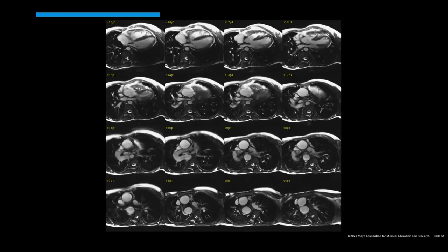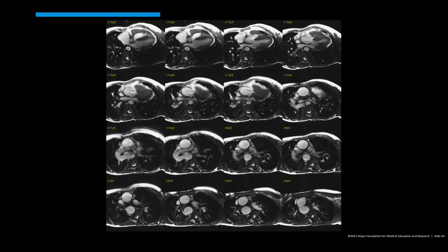We'll let these cardiac MR cine images play for a little bit while you all think about the 4 things that make up tetralogy of Fallot, the 4 abnormalities. We'll go through each of those in this case.